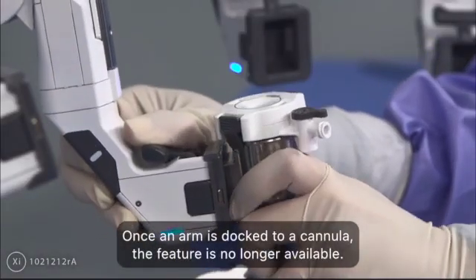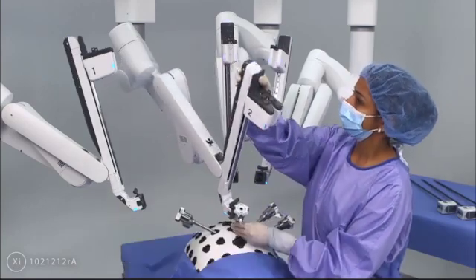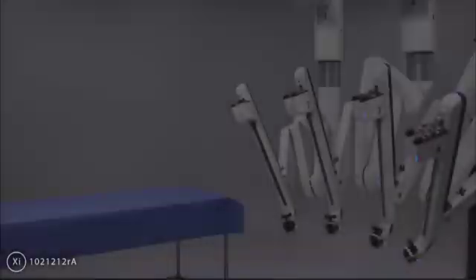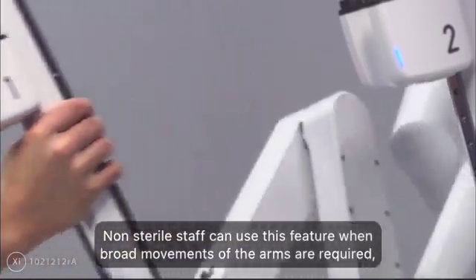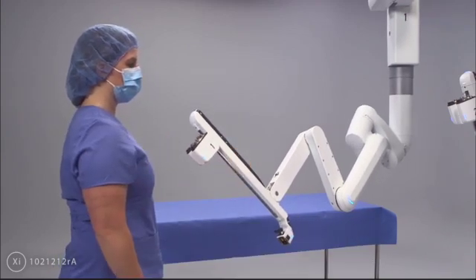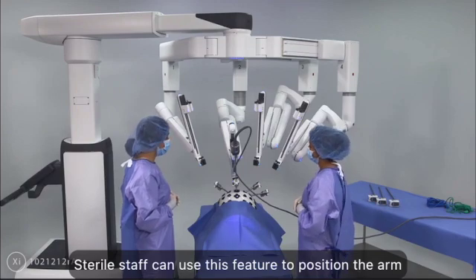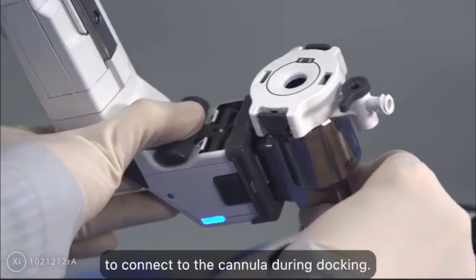Once an arm is docked to a cannula, the feature is no longer available. Non-sterile staff can use this feature when broad movements of the arms are required, like positioning the arms for draping. Sterile staff can use this feature to position the arm to connect to the cannula during docking.